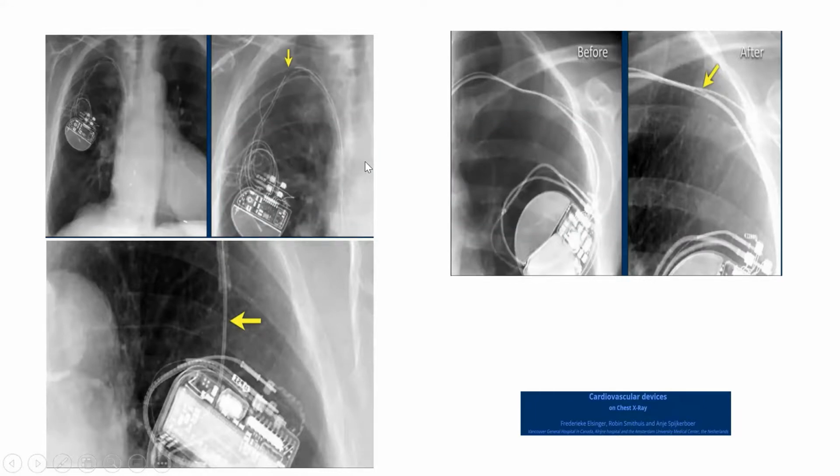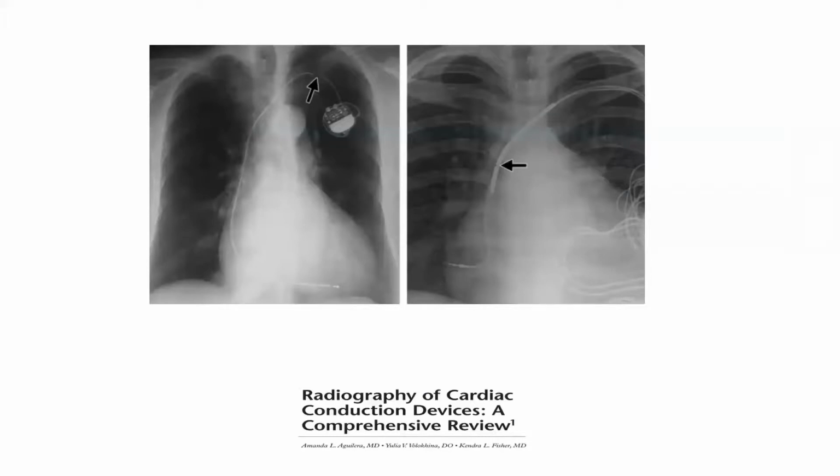So when we talk about fracture, don't scan the X-ray only for actual separation of leads. You have to zoom in and look, because it might just be like this, a tiny crack, hardly appreciable unless you focus so carefully. So lead fractures, you have to scan the X-ray carefully. Again here, look at the lead fracture proximally here, and here you see the lead fracture midway. See here? So these are lead fractures.